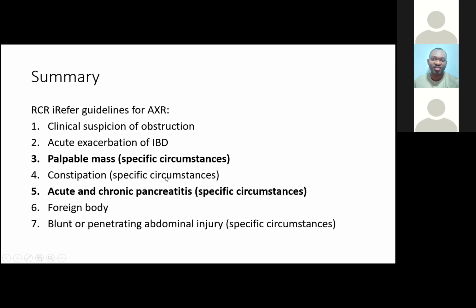Again, you should have a mental picture of where things lie: the liver lies in the right upper quadrant, the spleen in the left upper quadrant. Roughly assess where the kidneys are, the psoas shadows, and the outline of the soft tissues in the pelvis. After that, I'll certainly look at the bones, and finally the lung bases as well. So that will be my basic advice. But if you have a mnemonic that you use, by all means use it, as long as you use it consistently. That's always the key. Use it all the time.